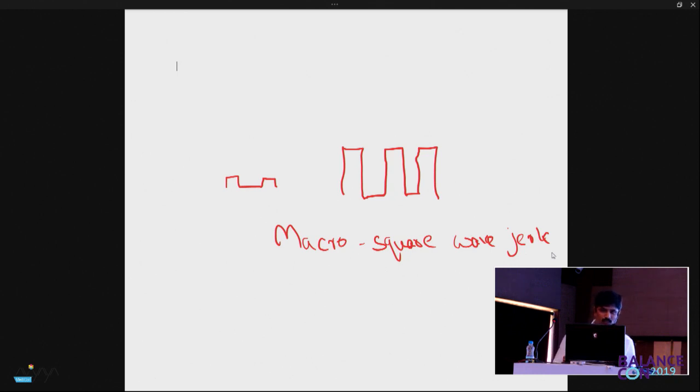Now I would want you to open page number 18. So here are the descriptions of all the different kinds of these other words other than nystagmus. The key point I wanted to stress here is that every eye oscillation is not a nystagmus. We first saw a jerk nystagmus, then we saw pendular nystagmus, then we saw square wave jerk, and then we saw a macro square wave jerk.